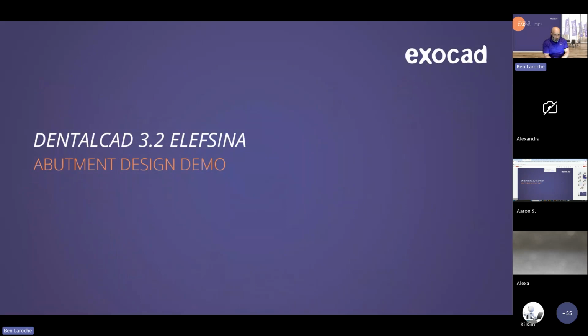From this, we're going to jump into the abutment design because Key teed it up so well and explained how things work. The prerequisite is knowing exactly what you're doing: the difference between a custom abutment and a screw retained crown, and also the components. As complex as that might have seemed, I can validate and completely confirm that once you get into it, it really is like Lego parts.